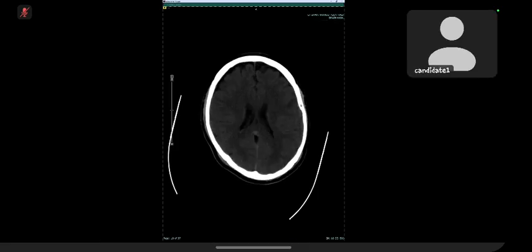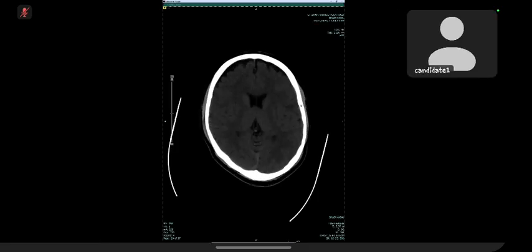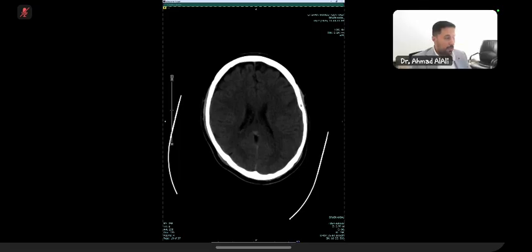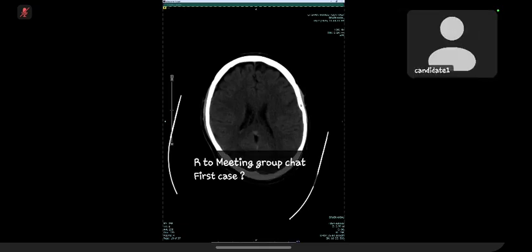If the patient is on the table, I will go for the contrast images to rule out what is happening in this hypodense area. The patient actually is allergic to iodine contrast, and this option is not valid at the moment. Anything else? We will proceed with the MRI brain.